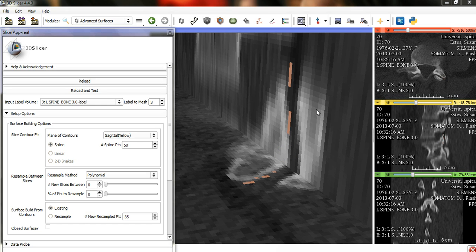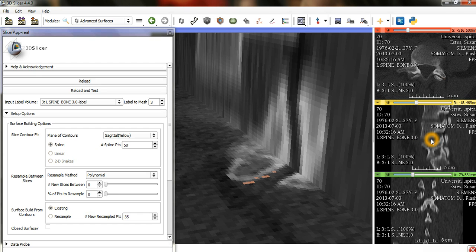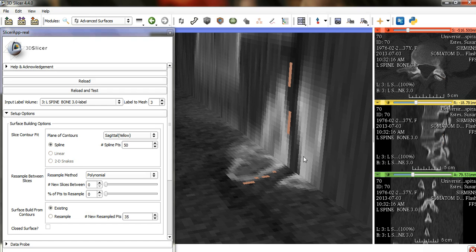So where I'm clicking on the mouse as we move back and forth here along that plane, pick this line along the edge. And so I've gone through and fixed that functionality so it works. And so I've already labeled each point.